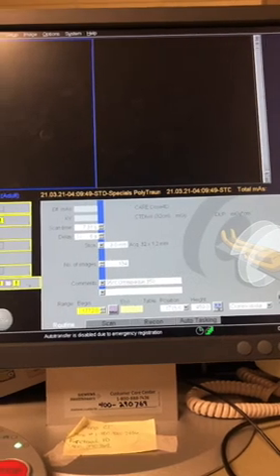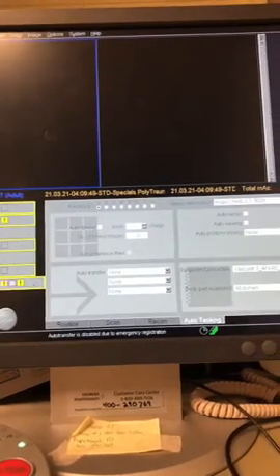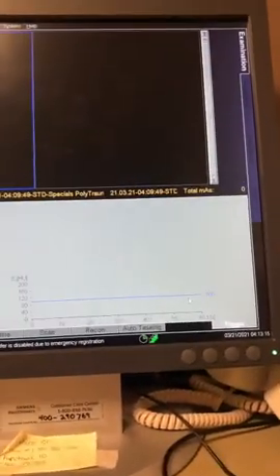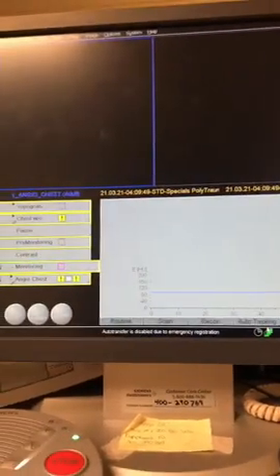Yeah, and a 4-second difference in our delay. That's it. Let's see where it's set to trigger. We don't have that set up, so I can't. Let's see where the trigger's set. Yep, at 100 Hounsfield units right there, and that's adjustable. You can click it and change it, but it's set to be at 100.